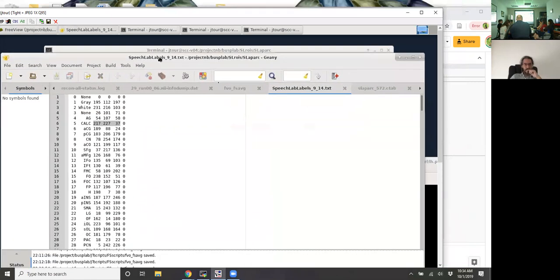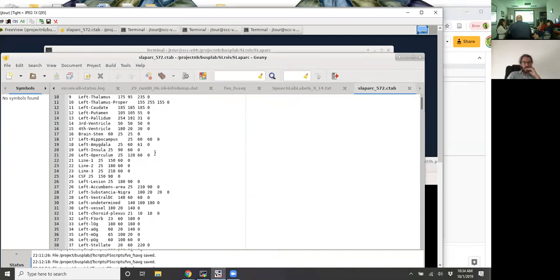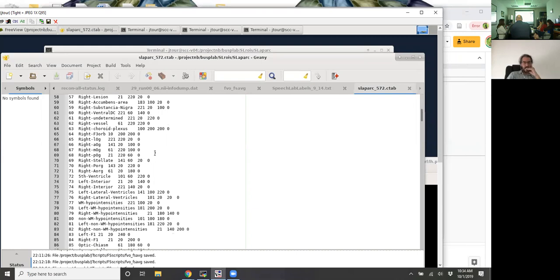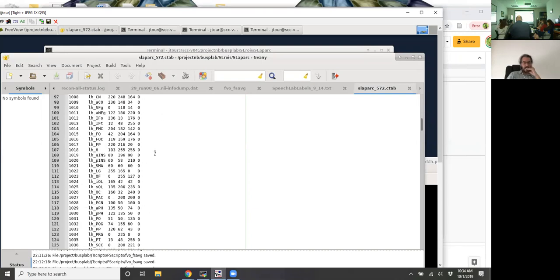The kind of color table that we have will behave in the volumes more like what you're thinking anyway. So it still gives a color. There's still a color assigned to each of these. And I believe that color link, so if we take, let's see if we can find one of our anterior insula.